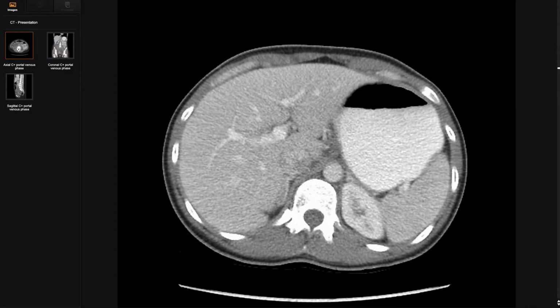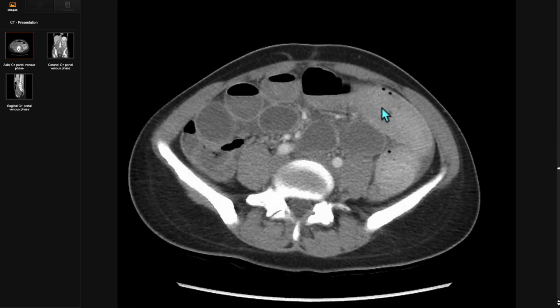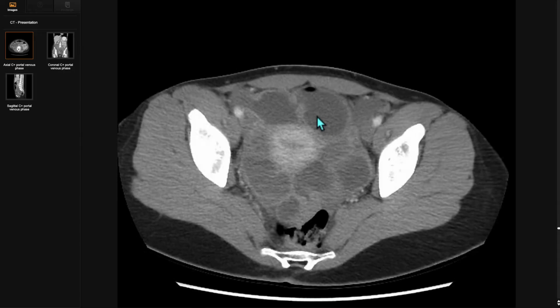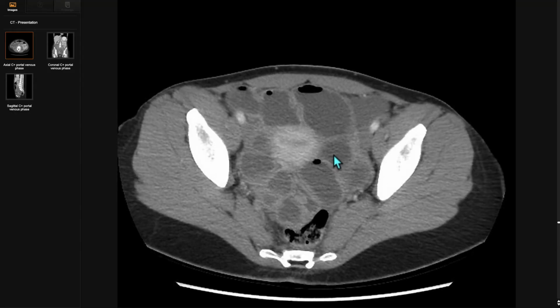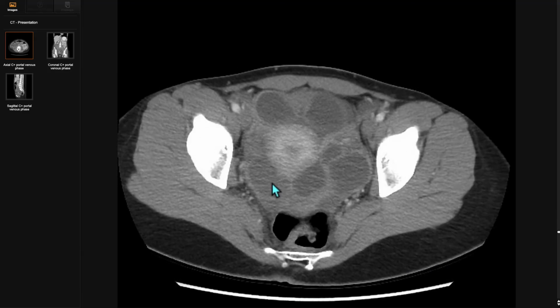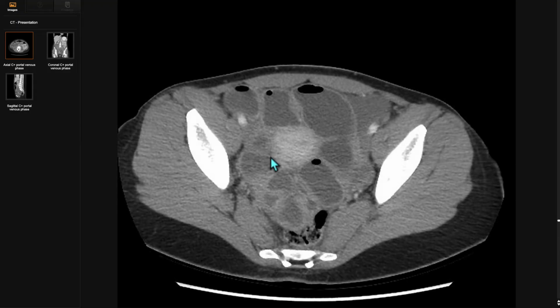This next patient is a young female presenting with small bowel obstruction. Here we find the oral contrast dissolving into dilated distal small bowel loops containing darker, more fluid-like contents, indicating that we're nearing the point of obstruction. But as we try to trace out the distal small bowel, it becomes quite difficult. We find these lobulated, thickened distal small bowel loops, which are intimately associated with the uterus and adnexa. But beyond that, it's difficult to make a diagnostic comment as to the cause of obstruction.